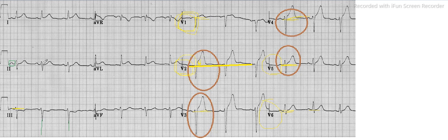In lead 2 there is slight, but it seems pretty okay, and AVF it is okay. So the basic idea here is that it's an example of anterior MI, and since V2, V3, V4 and V5 are involved, and a certain degree V1 also, it's like extensive anterior MI.